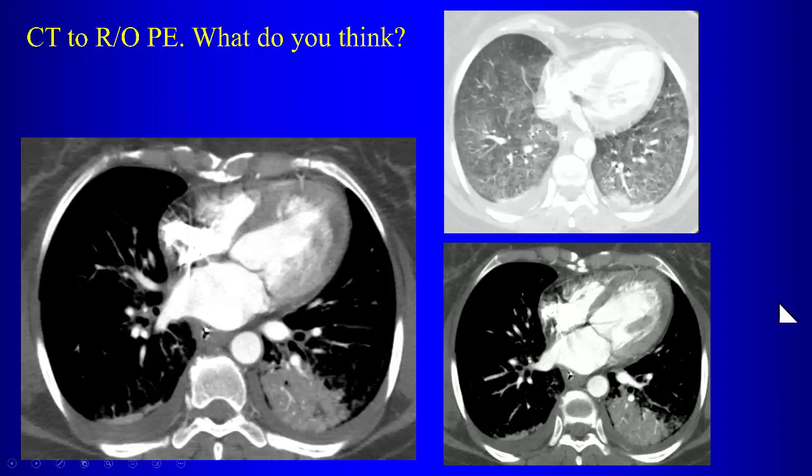It's enlarged. What part is enlarged? Left atrium. Left atrium and left ventricle, right. So, do you notice anything else about the heart that might explain why this patient has pulmonary edema? Subendocardial fat. Well, it's pretty subtle.